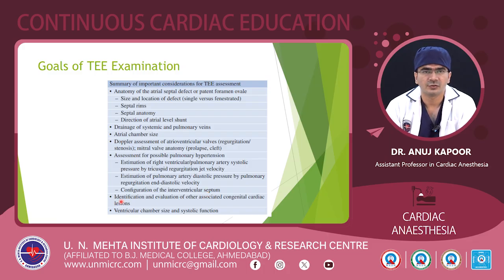Now, also the identification and evaluation of other associated congenital lesions, because with an ASD there are associated VSD, and also, as we have discussed, AV valve regurgitation and anomalous drainage of the pulmonary veins.